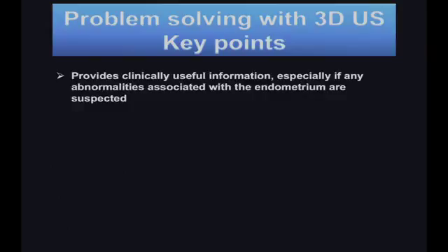So some key points from 3D imaging of the uterus and adnexa. This will provide some clinically useful information, especially if abnormalities associated with the endometrium are suspected.